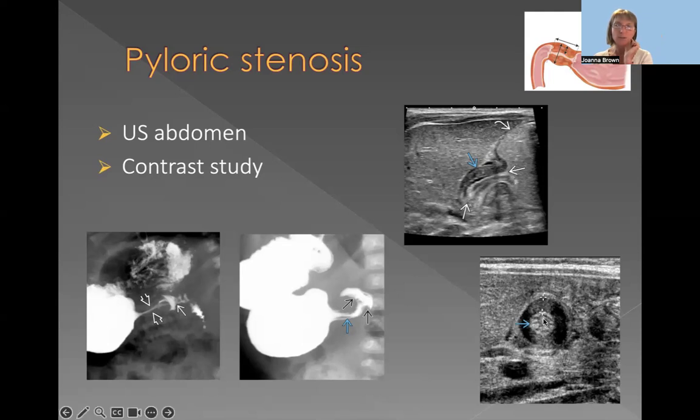This is mucosa, which is folded between because the thick wall is pushing it inside, and it's folded mucosa. If you have an intussusception, it looks different because you will have another loop of bowel inside with additional 5 different walls. So it's more like a donut shape. This is just a single loop of the bowel.